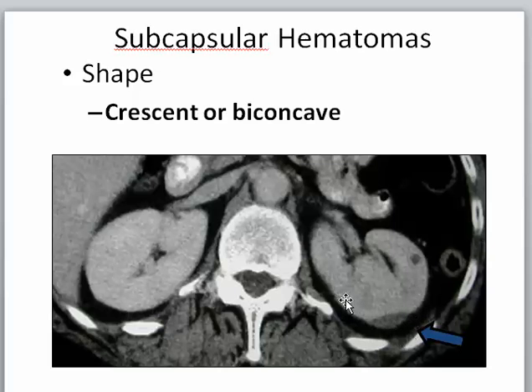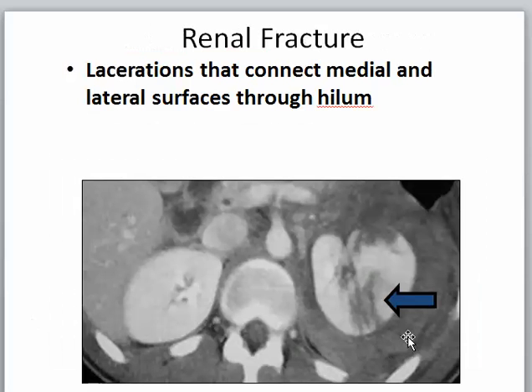You can draw the kidney, still the kidney is there, and this one we have the kidney shattered or disrupted, and then we have hematoma limited to this area, so it is around the kidney, so it is perirenal, and going anterior it is pararenal, it is bulging anteriorly.